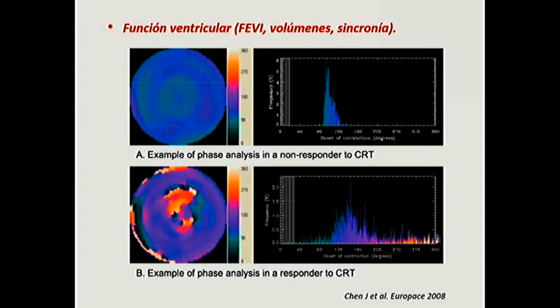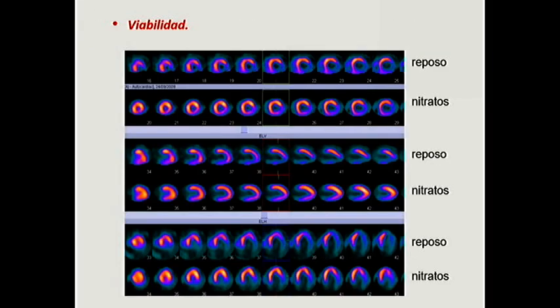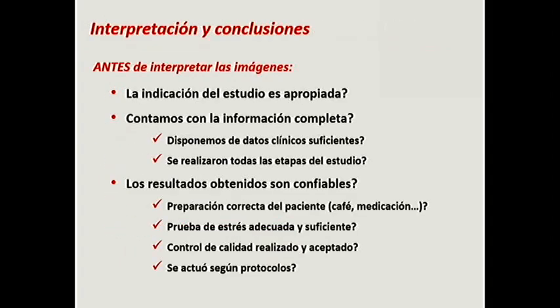So this is important, especially if we have the phase analysis software so that we can see the ventricular synchrony. And of course, if the question is about viability, we already conducted a viability study with nitrates, and we have to properly inform and answer appropriately to these questions.